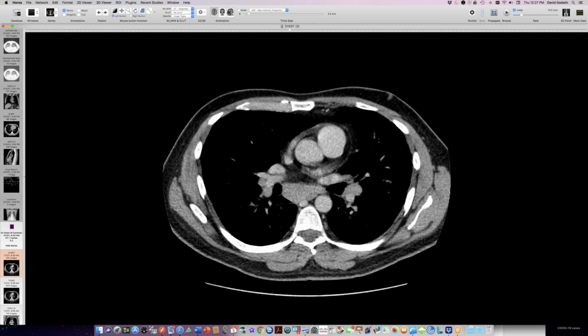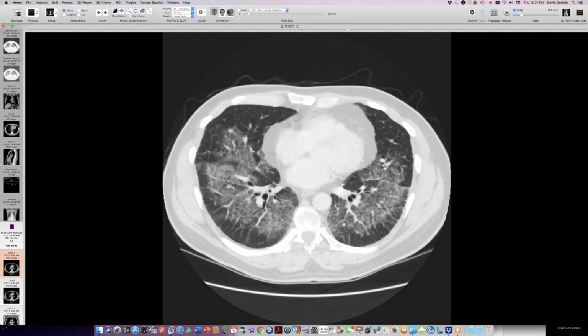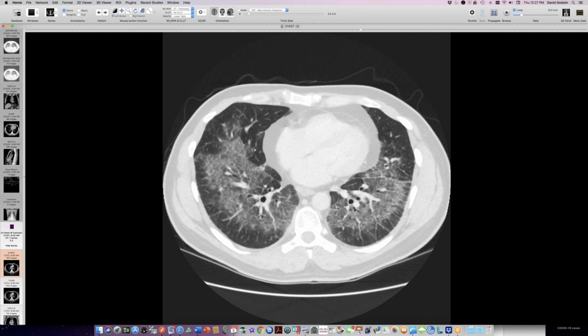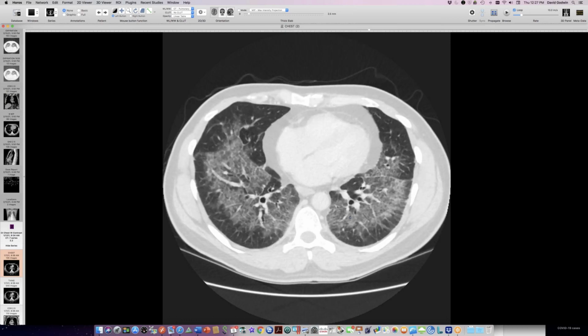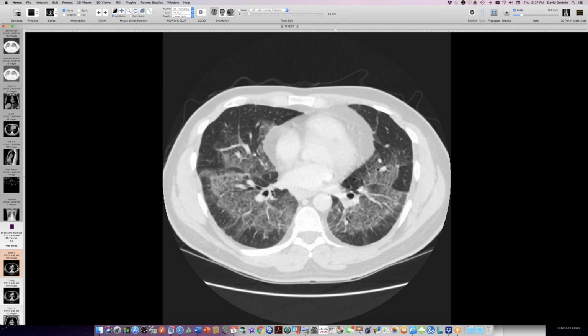Okay. Can you show the lung windows again on the first one? Oh, that's really pronounced. I'm not sure if it would make any clinical sense, but PCP was at some point ruled out. Yes, his presentation doesn't fit with that, and cultures were negative too, I think. I mean, it looks fluidy. It just looks like fluid. It does, doesn't it? Really looks like something backing up in the lungs.